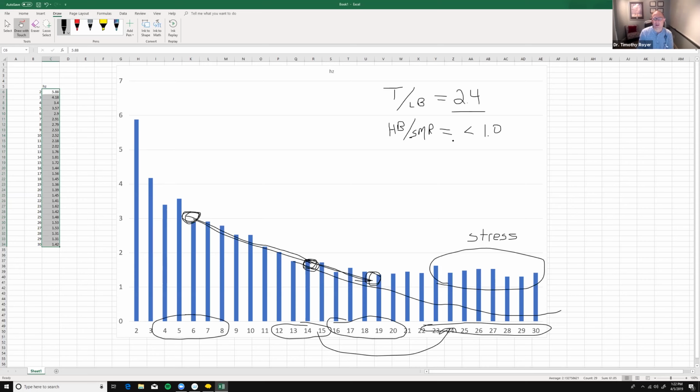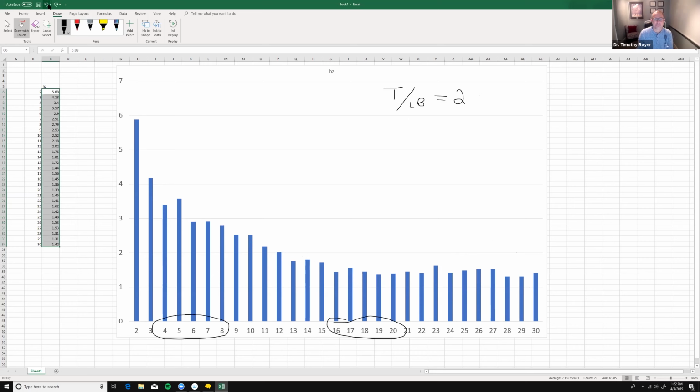Because in order to create this ratio, that slope should look like this, and there shouldn't be these high amplitudes going on, okay? So let's clean some of this up, and let's talk about some specific, more diagnostic biomarkers, okay?